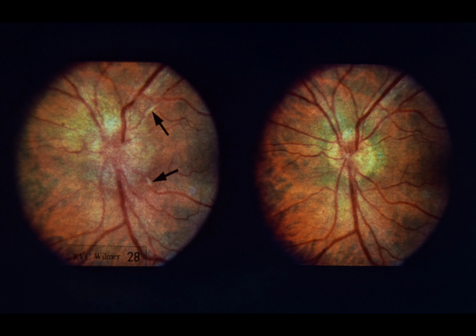The patient was treated with penicillin for 4 weeks. The rash disappeared and the anterior chamber reaction resolved. Visual acuity in the left eye improved to 20/20 and the central scotoma resolved. Right. 7 weeks later, the left optic disc is mildly hyperemic and the perivascular exudates have resolved. An unusual aspect of this case is the unilateral involvement, since syphilitic optic neuritis is usually bilateral. With appropriate antibiotic treatment, the visual prognosis is excellent.